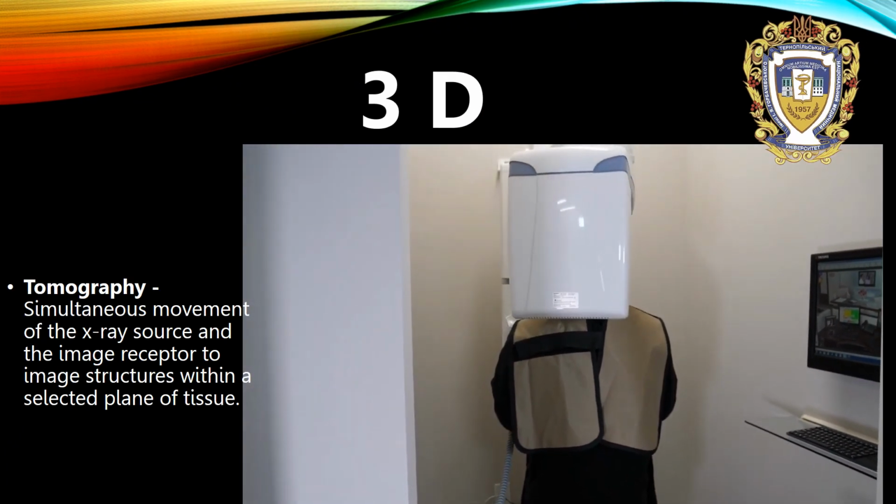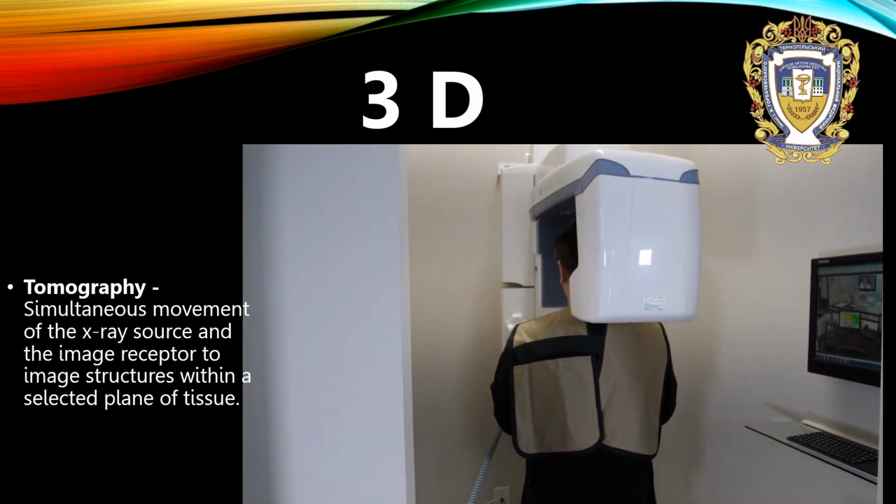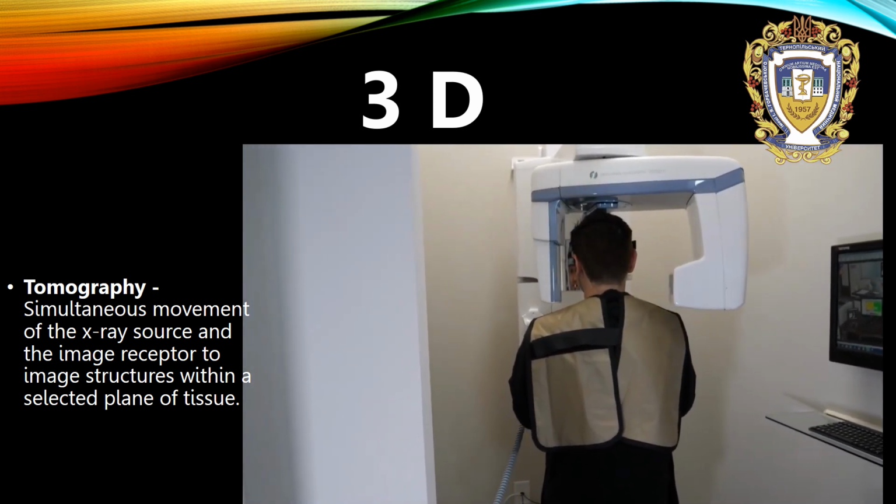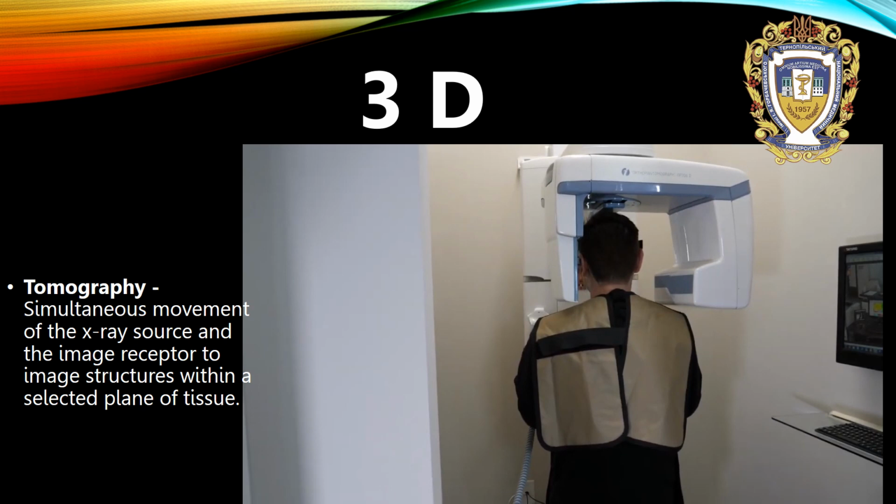And what kind of 3D methods can we use in dentistry and in medicine at all? Tomography. What is this tomography? It is simultaneous movement of the X-ray source and the image receptor to image structures within a selected plane of tissue.